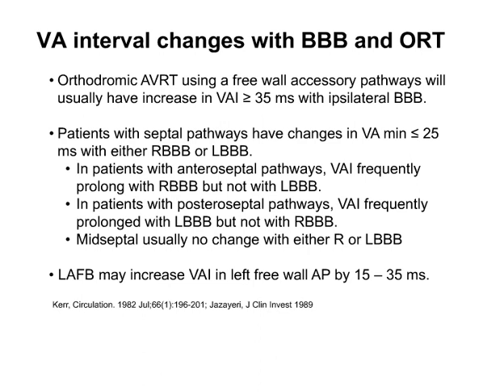Okay, so they can look at this and references about how much of a VA interval change you expect with bundle branch block during ORT.